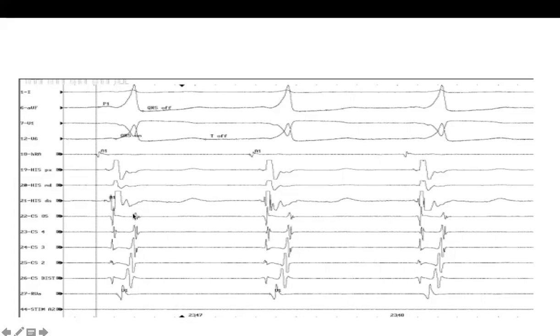Right-sided? In the distal, that means activity in the left comes first. Since activity in the left atrium has been recorded earlier, we are talking about a left-sided accessory pathway.